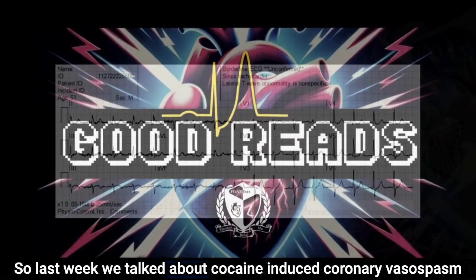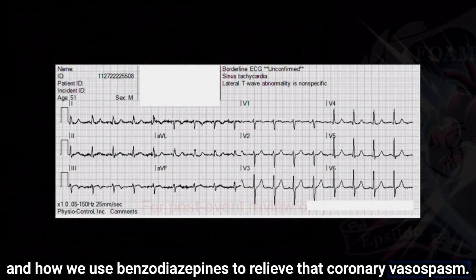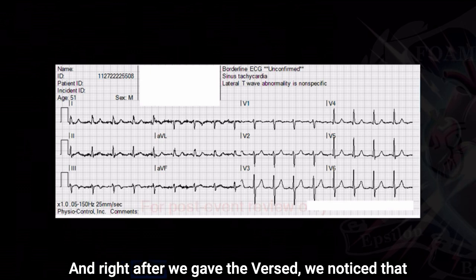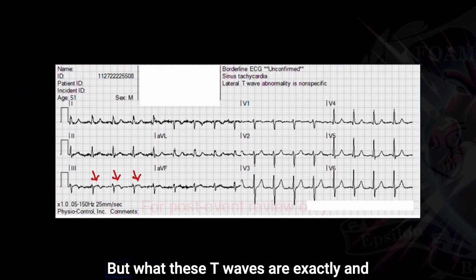So last week we talked about cocaine-induced coronary vasospasm and how we use benzodiazepines to relieve that coronary vasospasm. And in this 12-lead from last week, we saw that prior to the benzodiazepine, there was quite a bit of ST segment elevation. And right after we gave the Versed, we noticed these biphasic T waves in the inferior leads. I wanted to talk just a little bit more about what these T waves are exactly, and I'm going to break this up into two parts.